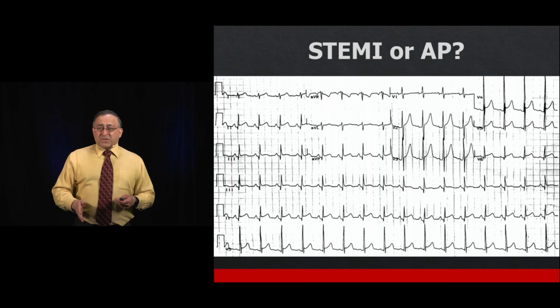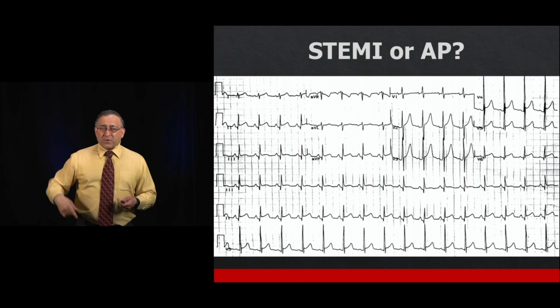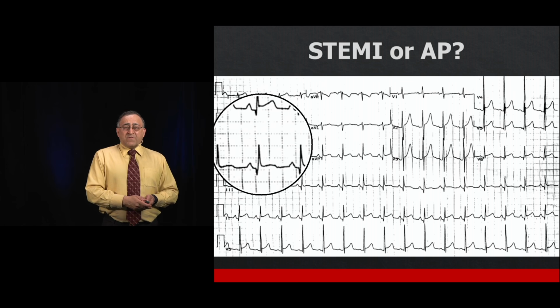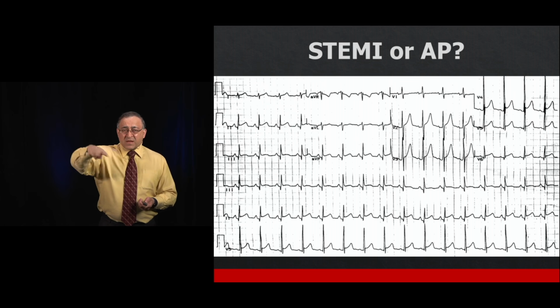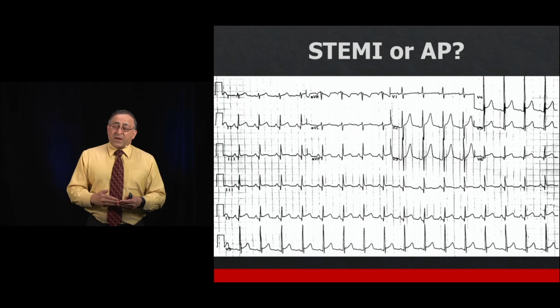And the answer there is no. All of the ST segments look like they're concave upwards. Sometimes people ask about lead 3. Even lead 3, right after the QRS, it looks like there's a little bit of a concavity there. So this doesn't meet any of our STEMI criteria.